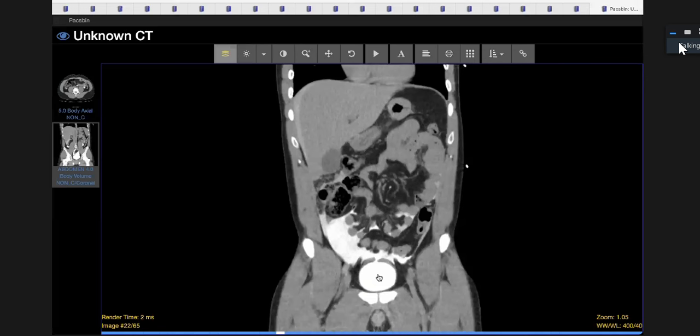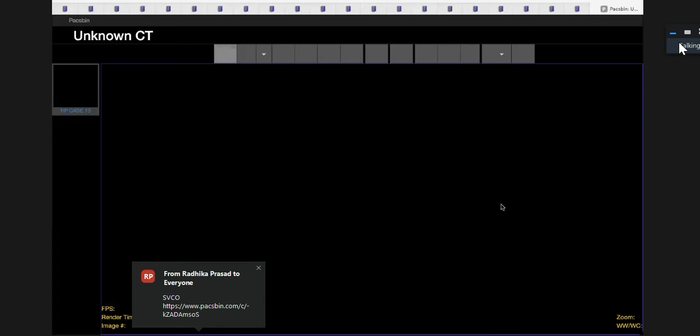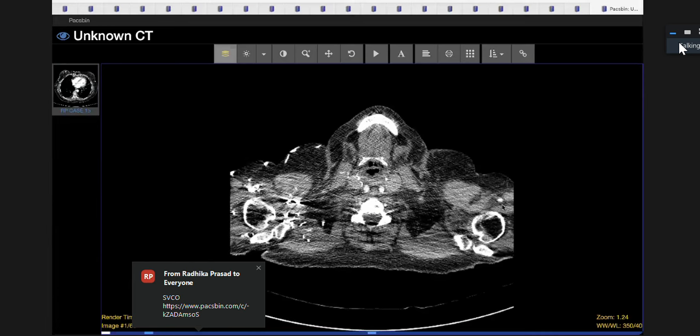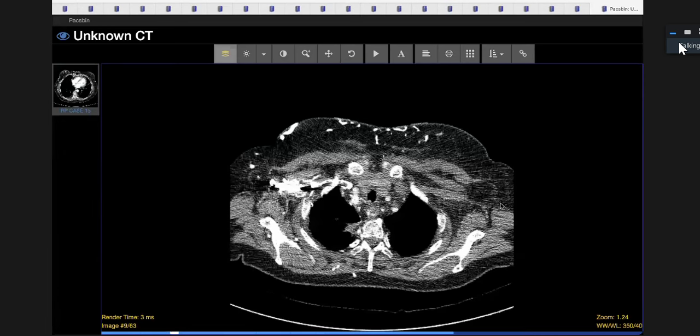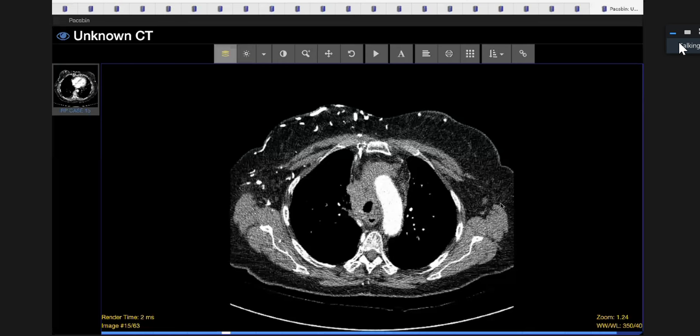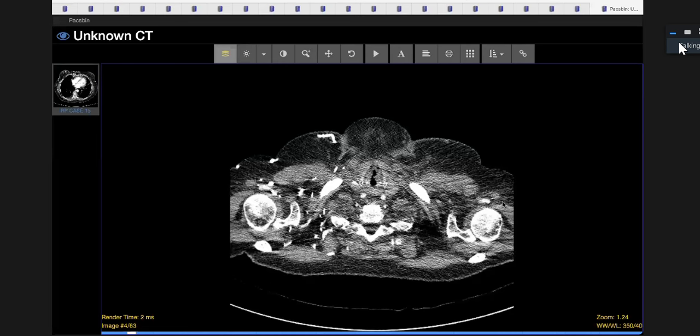Types of bladder rupture. Here's another case. Do they catheterize this patient? Do they catheterize if the bladder is ruptured, once they know they've got this? I don't know the answer to that. It would probably make sense to, wouldn't it? Otherwise, it'll just carry on leaking till they get him into theatre. I guess it makes sense to, yeah.